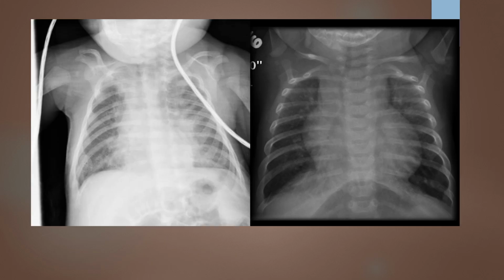Now you might look at this and be very concerned about the size of this newborn's heart. Do recognize that the thymus gland, which we really don't see in adults, is very prominent on newborns, especially neonates. So the fact that they'd have this increased mass in the thymus area is not that concerning. It's going to regress as the infant ages.